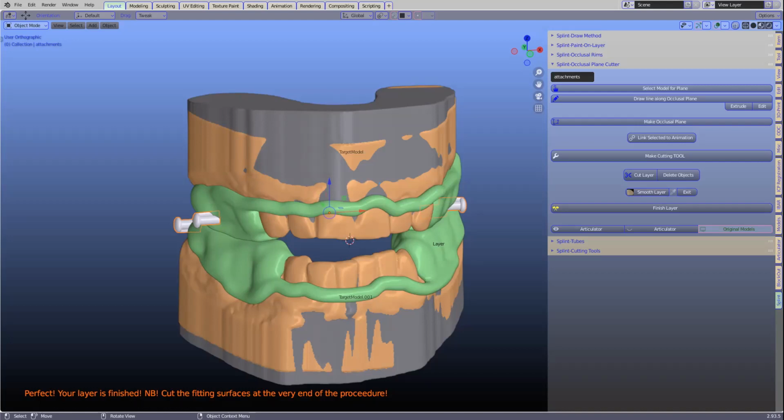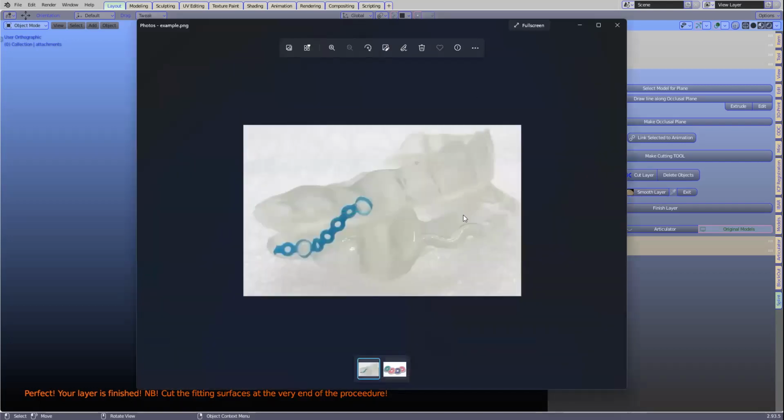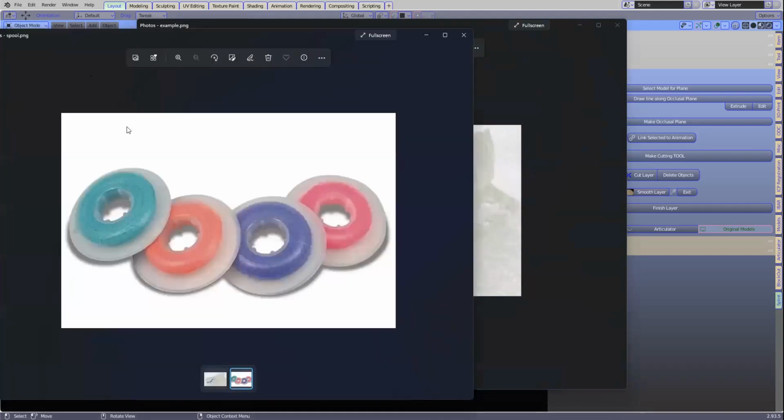Dual splints. Here. Can you see my screen? Yeah, that's the one. It's an elastomeric power chain, which is used in orthodontics. It's very strong, and those little loops are of great benefit because if you want to reset the jaw in a different position, you just change the loop. Instead of 3 links, you put 4 or 2 in between.